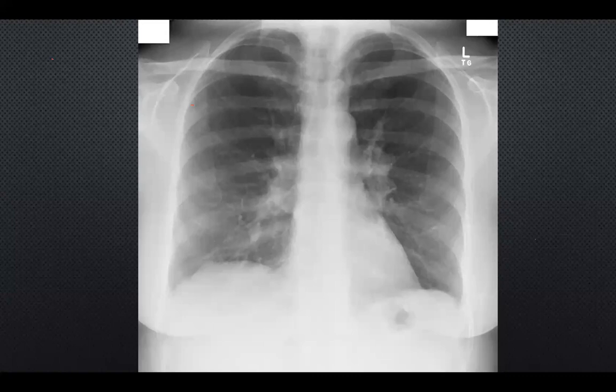So if you see bilateral hilar lymphadenopathy like this, so you've got both sides affected, what you're going to do realistically is send this patient for a CT chest. And on your CT chest, you'll find the subtle changes within the lungs that could tell you this is sarcoid. But in terms of just a chest X-ray, pretty much the bilateral hilar lymphadenopathy will point you towards that.